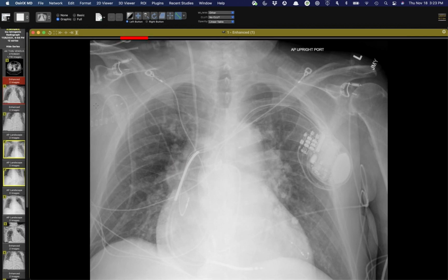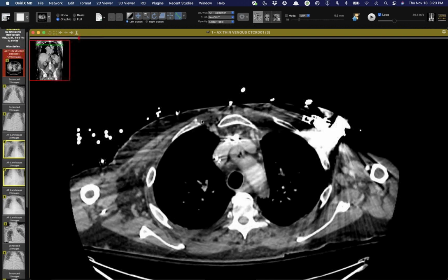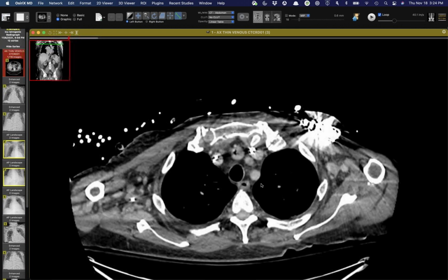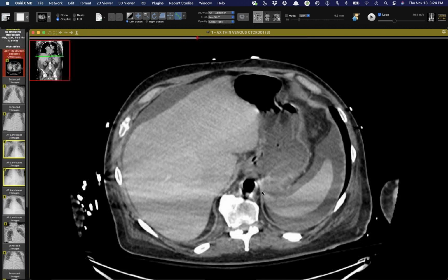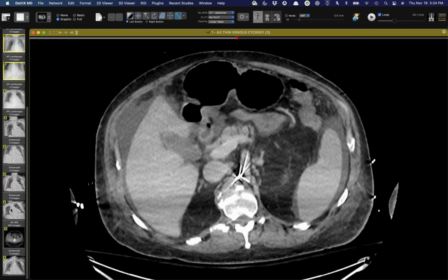And then in this case, though, you can see this is actually a right axillary approach. And so I was getting a little nervous when I saw this, because I was thinking it was probably too far into the aortic arch, proximally, and perhaps covering up the subclavian artery, the left subclavian. But you'll see the CT was done around the same time. Here you can see the brachiocephalic approach, and the distal marker is horizontal, but it's in the distal arch, so it's beyond the left subclavian. So this one's actually okay, and it's just the curvature of the aorta that accounts for the rest of the discrepancy in length. So this was still about 25 centimeters if you do a curved MPR and lay it out.